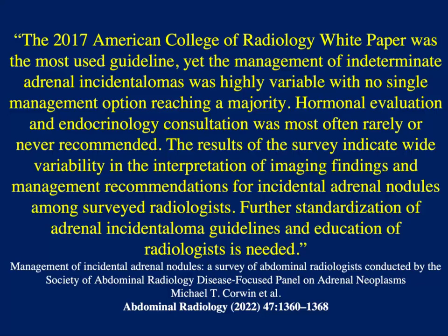So there is a challenge. Things are never that simple. Pheos can simulate adenomas, and they can overlap, and adenomas may not look like adenomas. We've had a number of large adenomas that have been resected because they look like solid masses. So just to make the point, adenomas can be large. Remember, they were 1/3 of the lesions above 4 cm in that Mayo series, so things are never as simple.